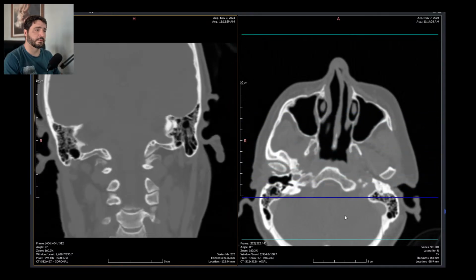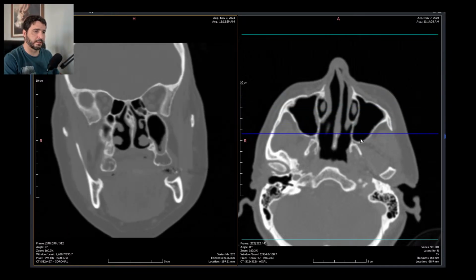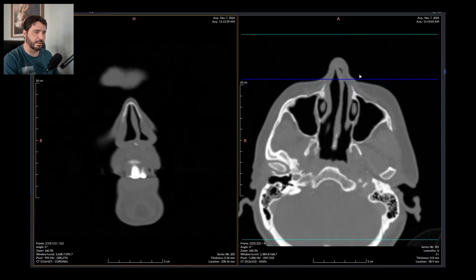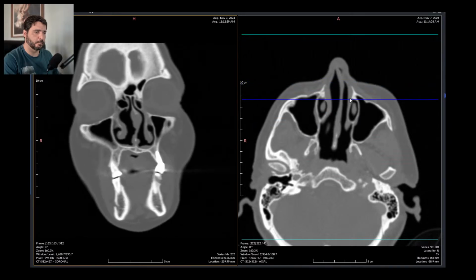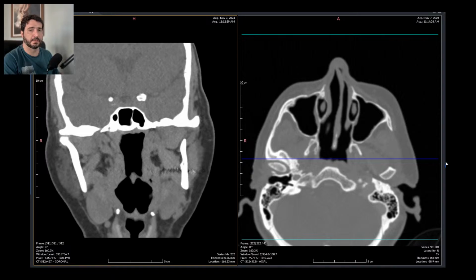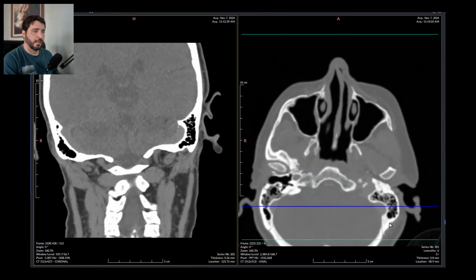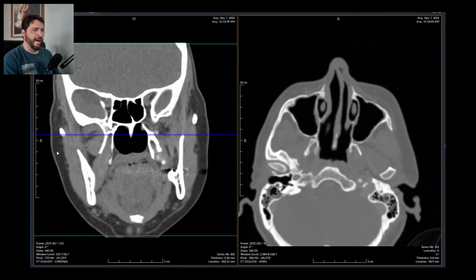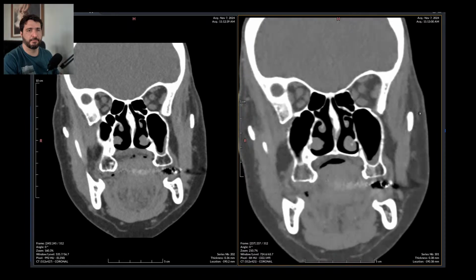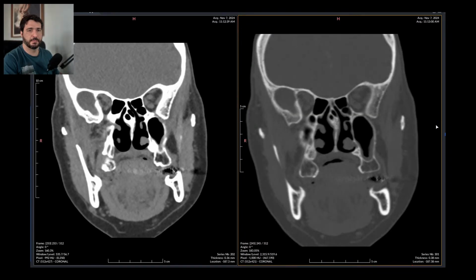But as much as I can tell in this case, all we have is a sinusitis, a mild sinusitis. Nothing more than that. A contrast enhancement didn't help at all. Just another crooked paranasal sinus exam.